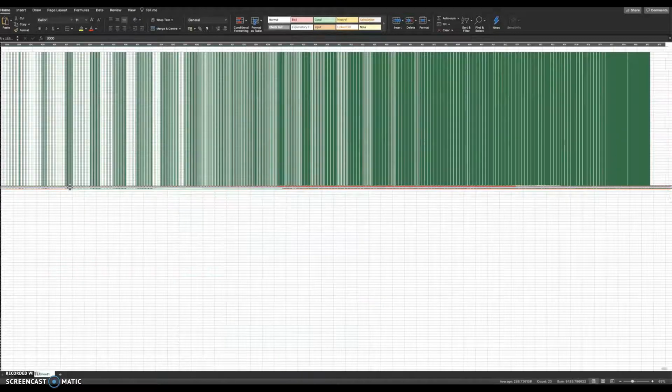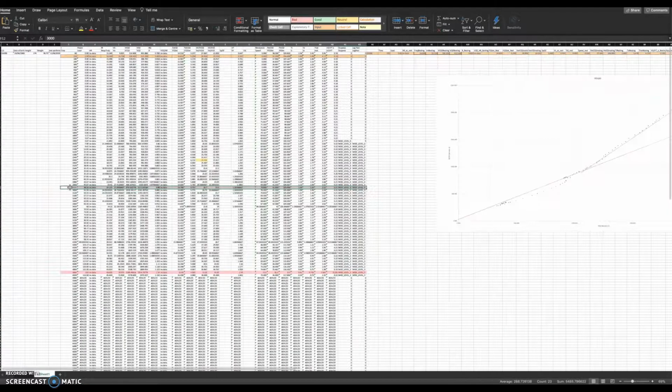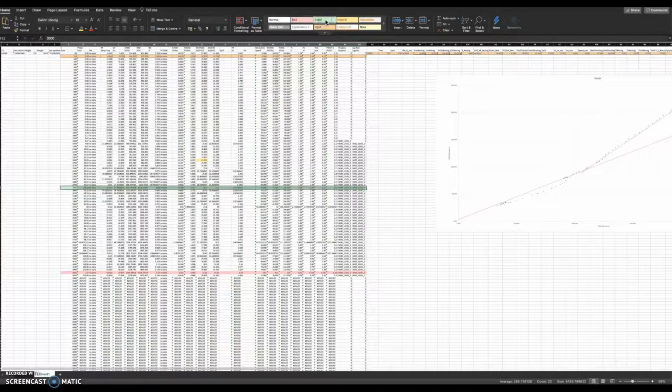Quite subjective is what you're thinking. I think it is as well, but that's how it's done. So we'll identify that. That's our gas exchange threshold. Okay, so this is the green that we're going to fill in up here.